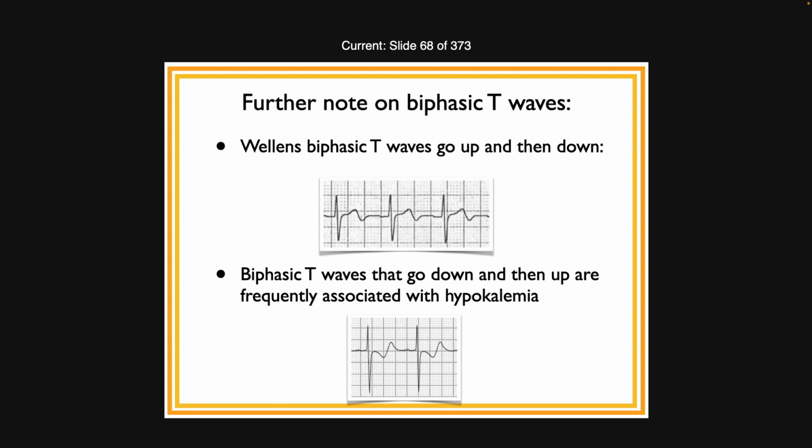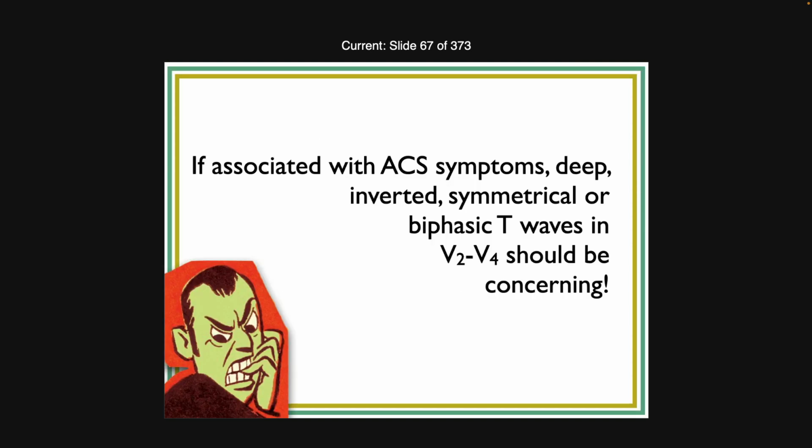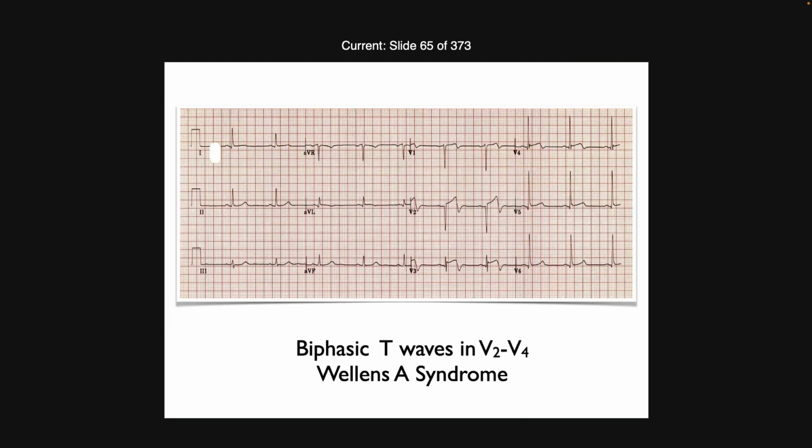It doesn't have to be ST elevation. In fact, in this particular case we've actually already got a septal anterior STEMI because there is ST elevation along with the Wellens, but it doesn't have to be there if it starts there. And let me say, if you see ST elevation with Wellens, it's still ST elevation. It's not like we say, oh, it doesn't count because it's with Wellens.